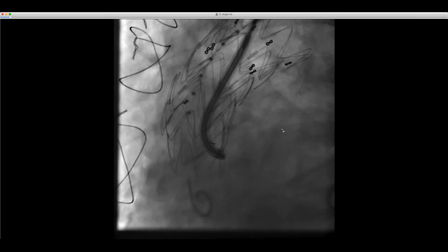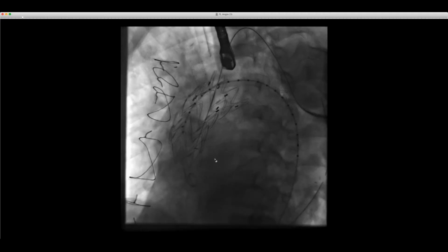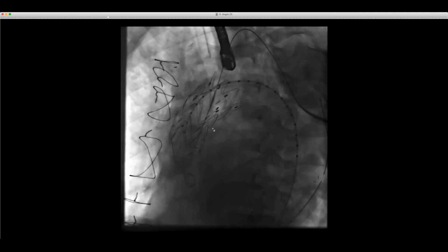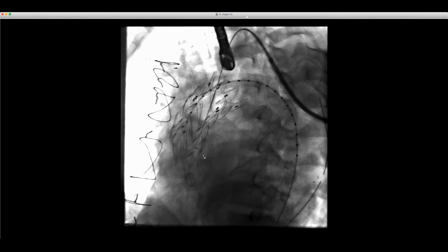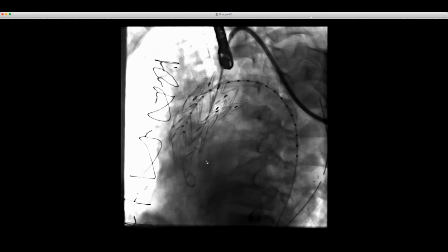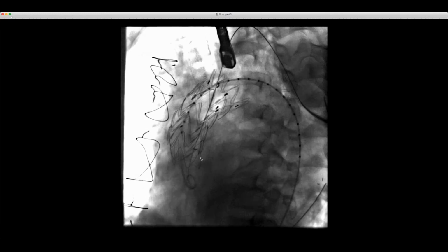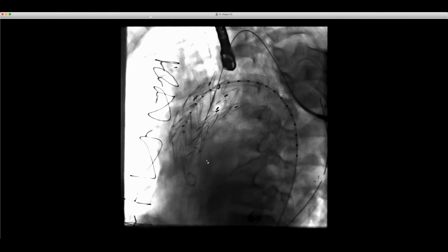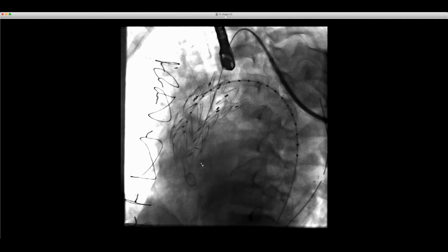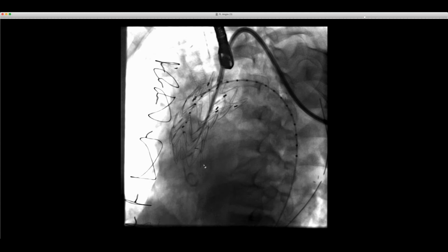See the angio now. One interesting thing about the angio is that you can see there are two overlapping endostents here. This is something I've never seen on an angio before, where you can actually see the proximal. Art Stillman shared this with me. One cause for the endoleak we had after the endograft was placed is incomplete apposition of this aspect of the proximal endostent to the aortic wall, and you can literally see that flapping right there.